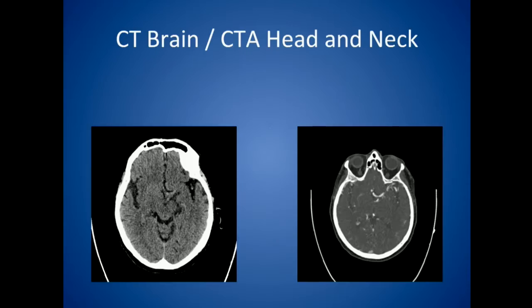So we do a CT scan, which is negative for hemorrhage, but it does show these densities in the middle cerebral artery. And sure enough, distally out here, in the M1, M2 region, she has a clot. But can we do anything? If you looked at the ASPECT score, this probably would be a go, but you don't really know what's going on with this patient. It's been a long time since her last known well.